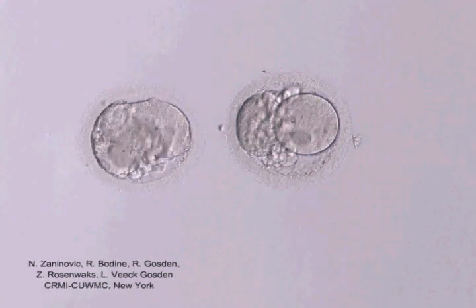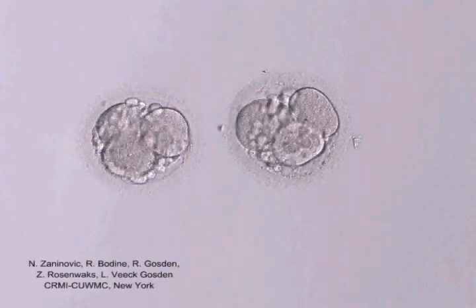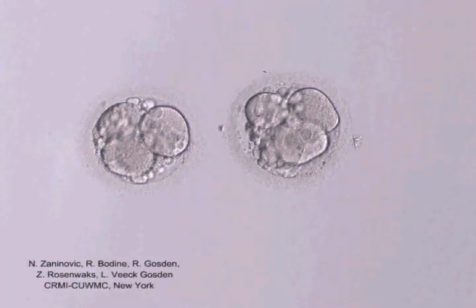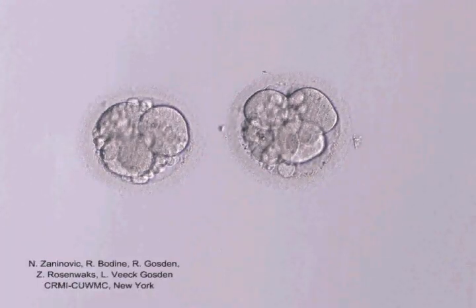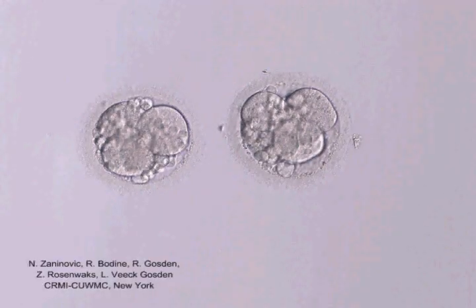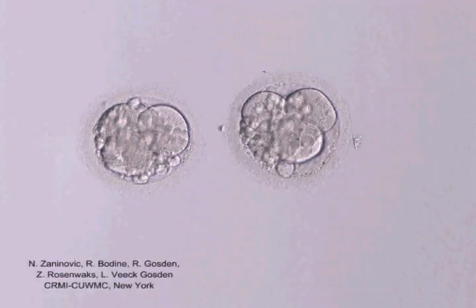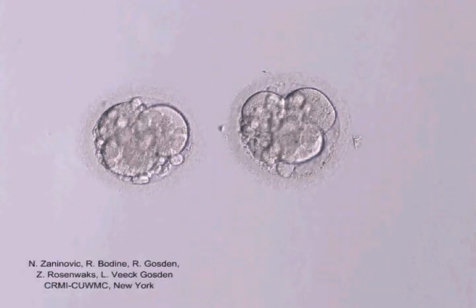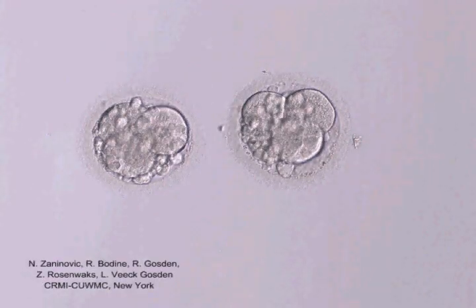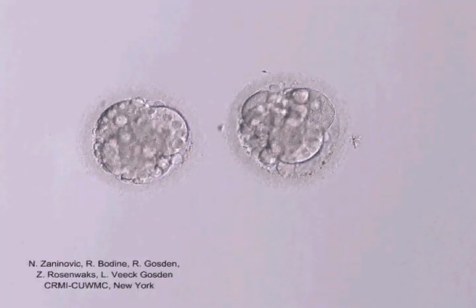On the second day, the second cleavage forms the 4-cell stage. One blastomere may divide before another, and an uneven number of cells often occurs during this transition. Embryos remain at the 4-cell stage for approximately 15 to 18 hours. One notes that neither embryo is quiescent during this period, both demonstrating active, vital cytoplasmic movement in advance of the upcoming and rather significant third cleavage.